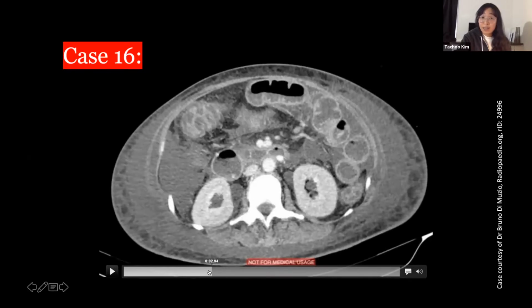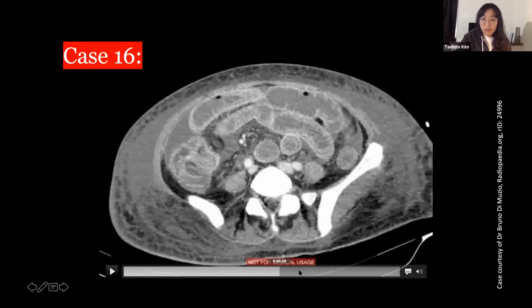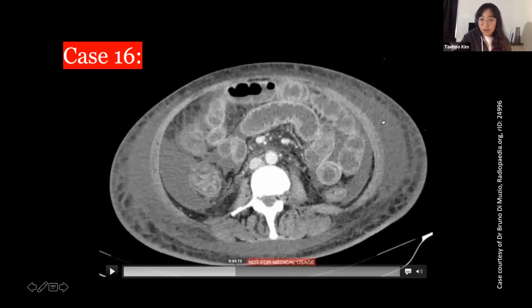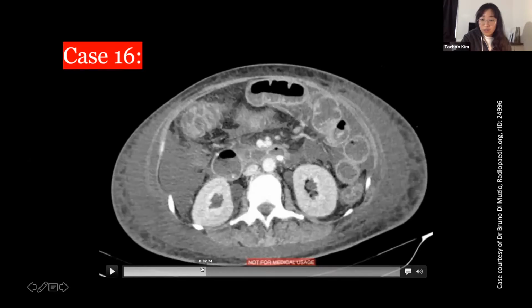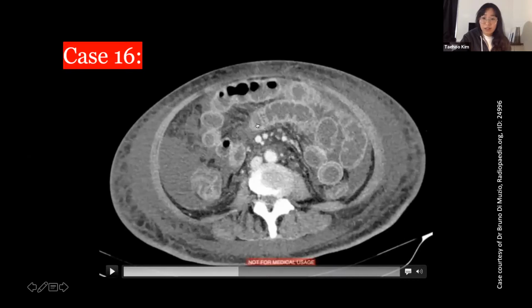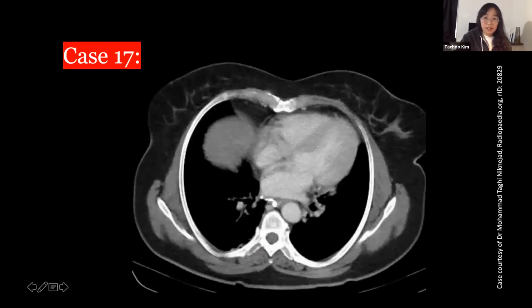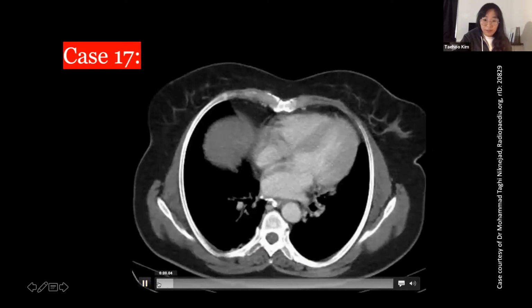And it's not ischemic either, because ischemic is usually a watershed area, like at the hepatic flexure, where the ascending and transverse colon meet, or the descending colon and the transverse colon meet, the splenic flexure. And here it's involving diffusely. And small bowel dilation, mildly dilated small bowel without transition points, likely reactive to what's going on distally. Okay, good job, guys.